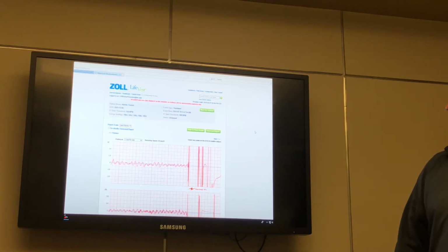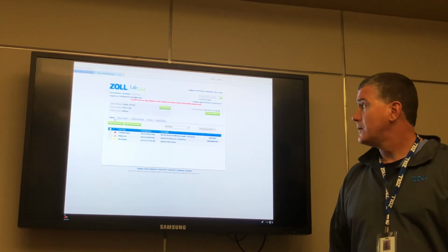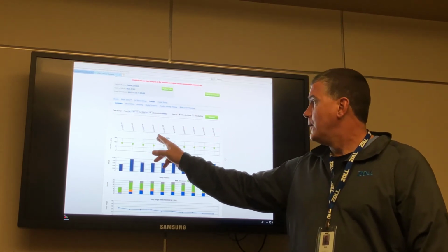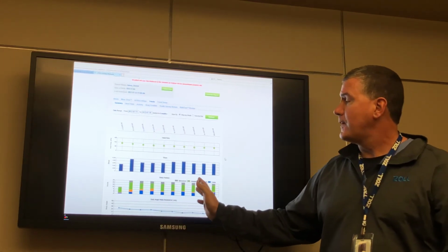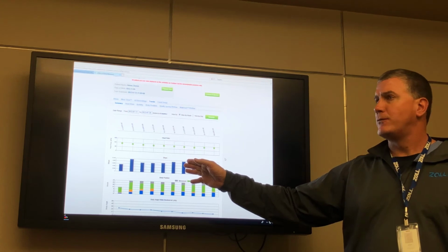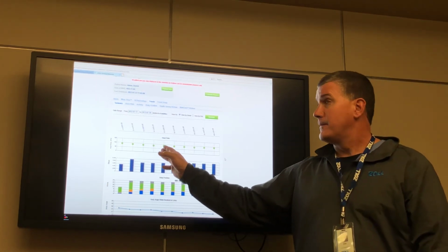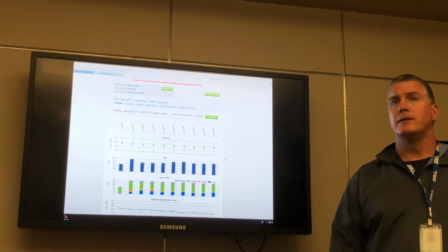Because on the summary, just click on Adams again. Perfect. So this is a summary page. Now, this patient didn't wear it long enough. What you'll see is a black line somewhere about right here going down the center. Everything to the left of that black line is in week increments. They wore it the last 14 days? Yeah. And everything to the right of that black line is days, the last seven days. So it shows you a 7-day printout.